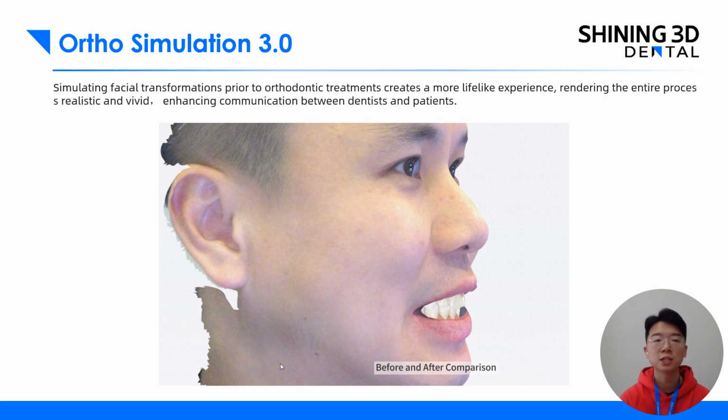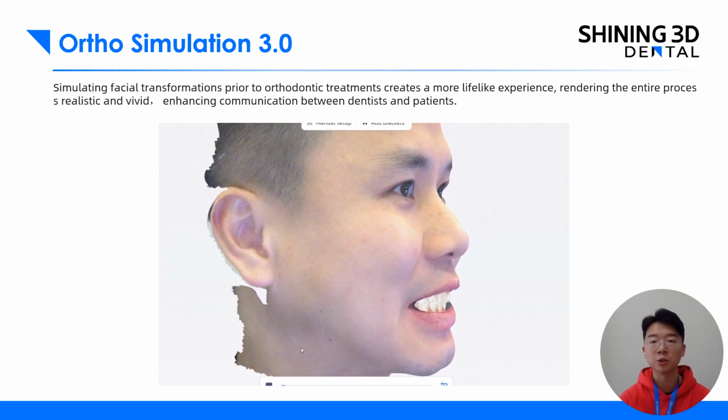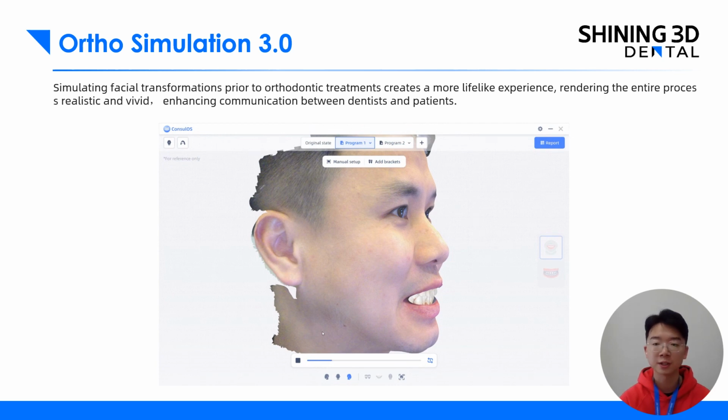So simulating the facial transformations can create a more lifelike experience and more lifelike simulation for the dentist and the patient, and it can give us a realistic and vivid impression of how the orthodontic treatment process goes. And then it can enhance the communication between dentists and patients. So you can see the changes not only happen in our intraoral scan data, but also the face data.